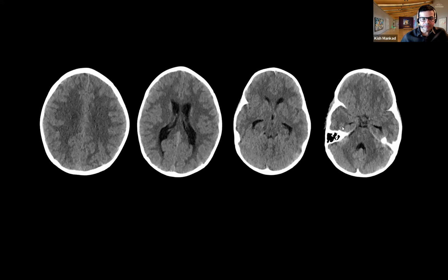You can achieve a CT non-contrast head scan in maybe a maximum of 7-8 slices to get most of your answers. But you can also do it in high resolution, which could be 1 millimeter or even 0.625 millimeters. I can show you a case of trauma after this to understand acute CT a little more.